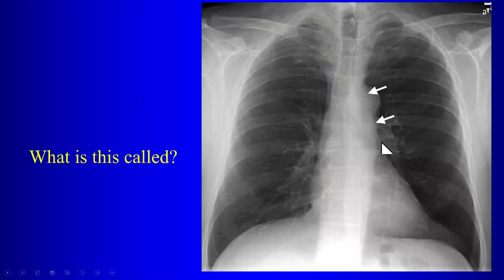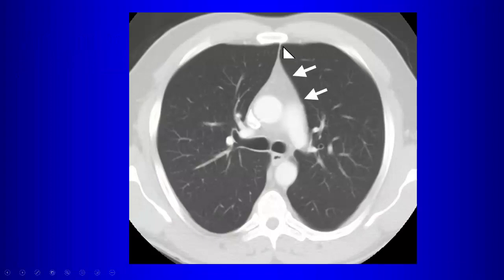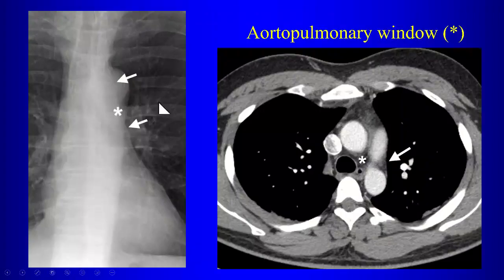This guy is the aorticopulmonary reflection. So this is the reflection of the pleura along the anterior mediastinum. All right, so that's along the anterior mediastinum. So it's the reflection of the pleura here. So what lives in here? What organ? Thymus, right. So the residual of that will be the fat, right, when you get fatty involution, but the thymus lives there, okay?